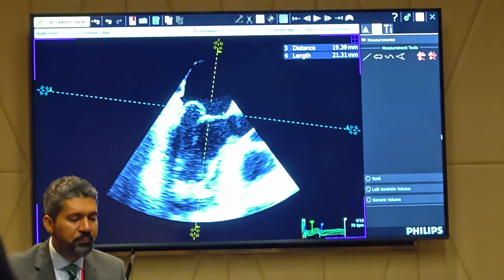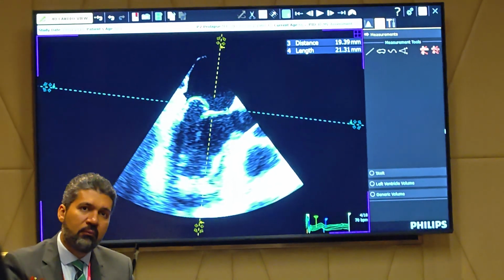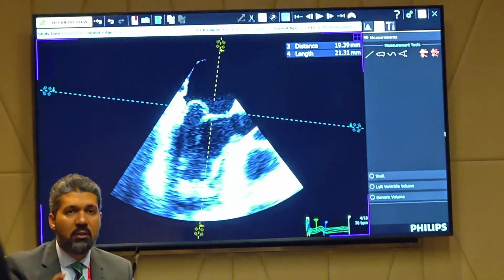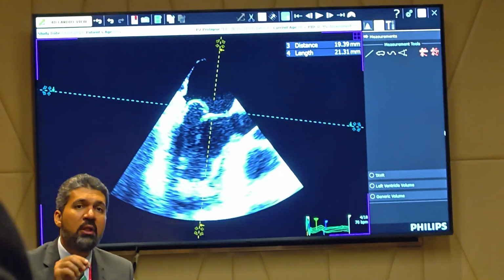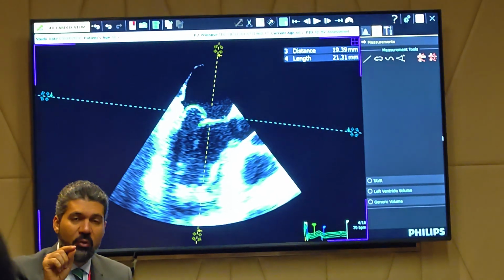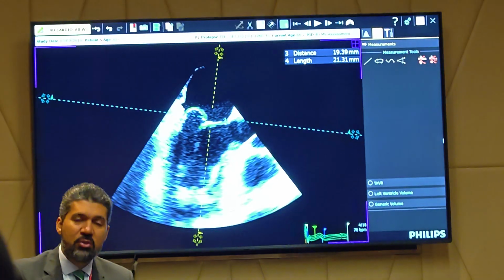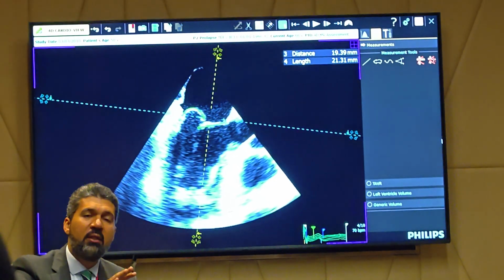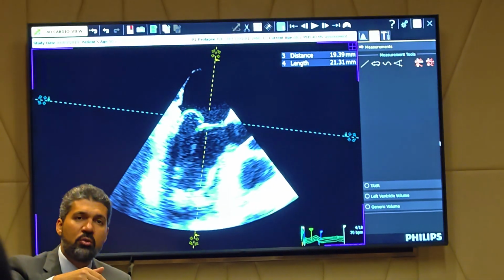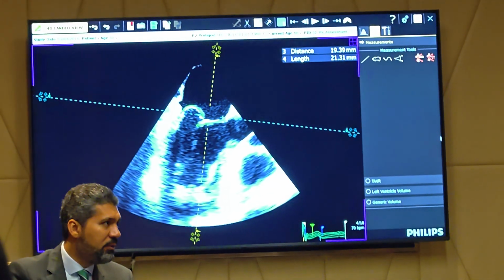Okay? And in this MPR, how to go about the valve area calculation? Because these are the parameters we need: posterior leaflet length, mitral valve area calculation. You remember when I told you the first step in any MPR analysis is to check the time first? Yes. Okay, the valve area should be measured in systole or diastole? Diastole. So this is not in this frame. Here we are measuring the annulus, we are measuring the leaflet length, and we can measure also for mitral valve prolapse something called the flail gap and flail width, right?